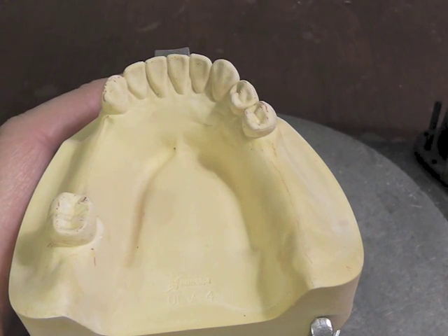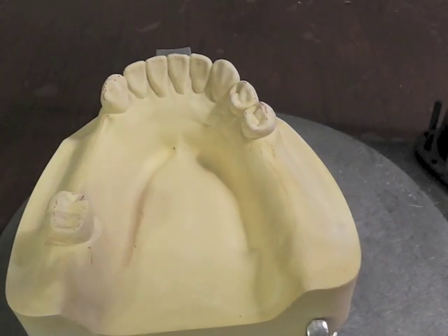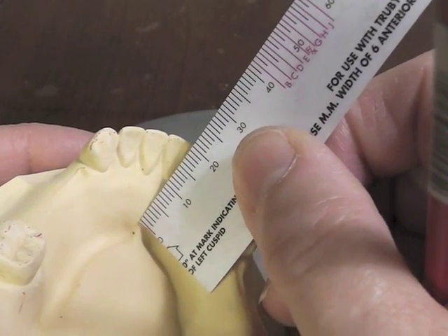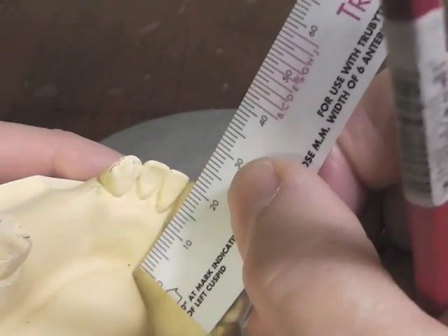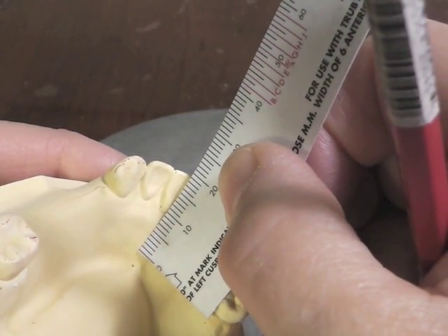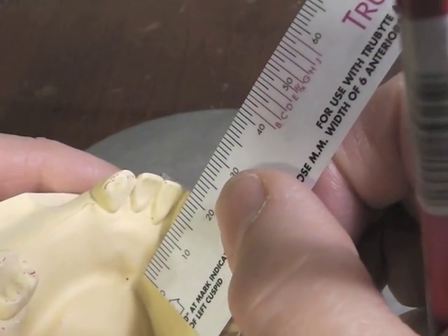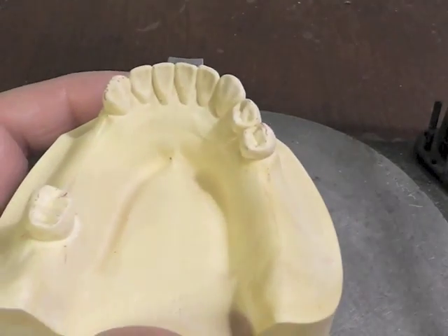What type of major connector would we want to have in this area? We would probably think in terms of a lingual bar, but we have to have at least 8 millimeters from the floor of the mouth, which I see a frenum attachment coming up to here, so we can't violate that frenum attachment. And we would have to have 8 millimeters between the frenum attachment and our marginal gingiva. And I would say we are just borderline on that. So we would be able to go with either our lingual bar or our lingual plate on that one.